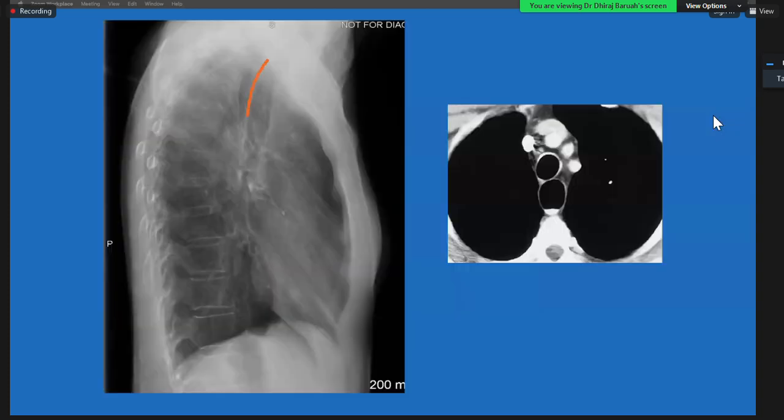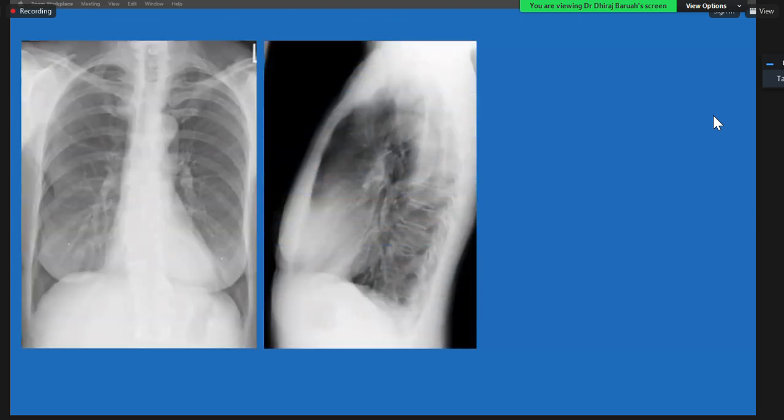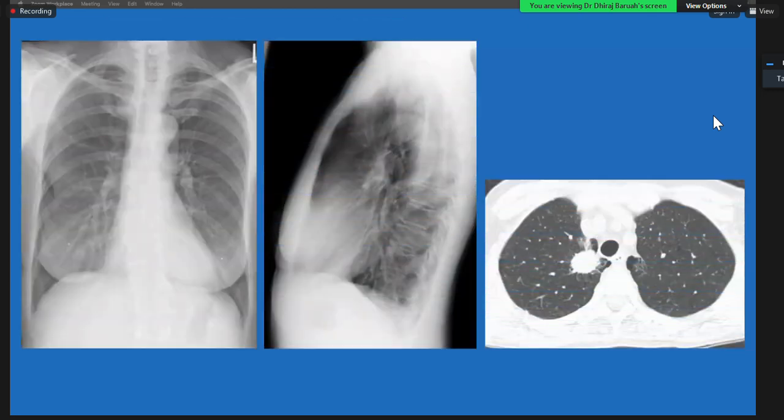So similarly, you look posterior to the trachea. This is the posterior tracheal line. You have the aortic arch here, and you have the anterior vertebral margin. So this retrotracheal triangle is also called Raider's triangle. That is the area you are looking at. And if you have a lesion out there, like in this case, a big lung cancer hiding, if you do not look at that area, you will not see that abnormality. So that is the point here. You'll have to look at that area.